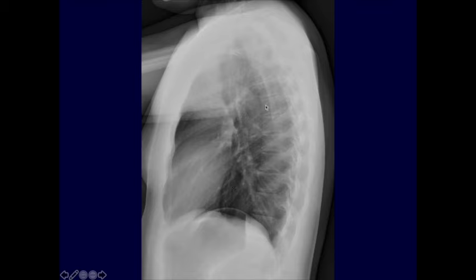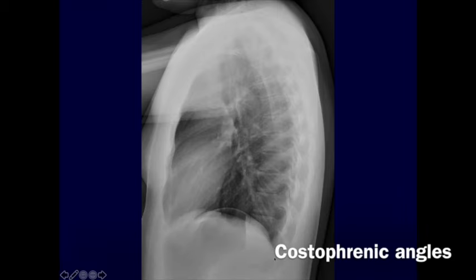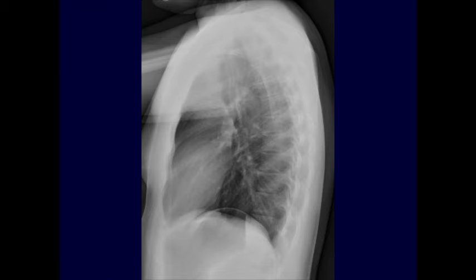So I'm looking at the spine itself, but also looking at the lungs overlying. So the lungs should get more and more lucent as you move more inferiorly. Oftentimes, if you have consolidation in either of the lower lobes, you're going to see that that does not happen, and there is something here that makes it look brighter. I then look at the hila, and we talked about that anatomy again just now, looking for evidence of lymphadenopathy mainly. And then looking at the costophrenic angles, remember that the lateral film is more sensitive for pleural effusions than the frontal film.